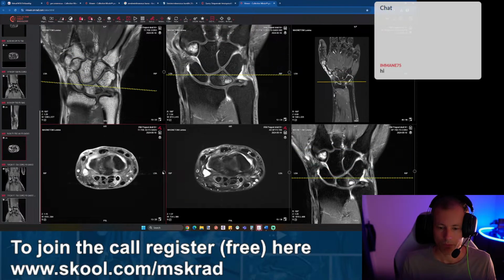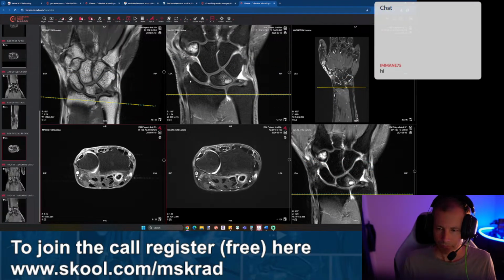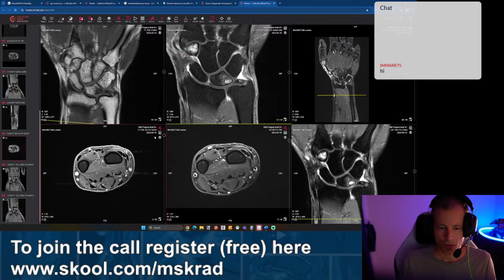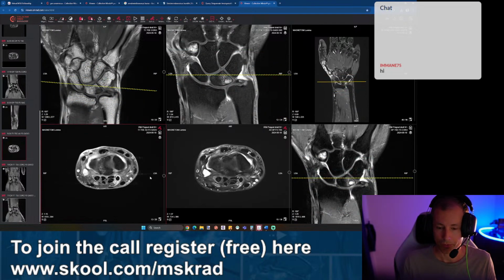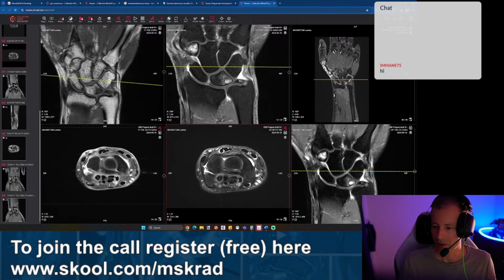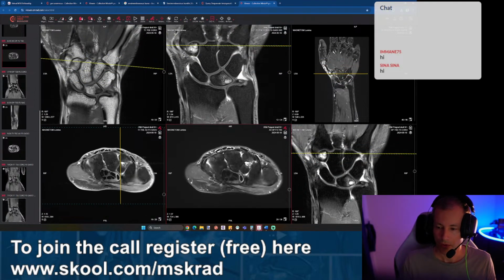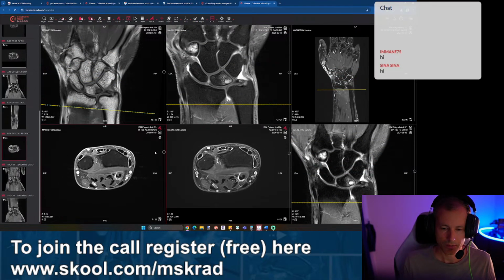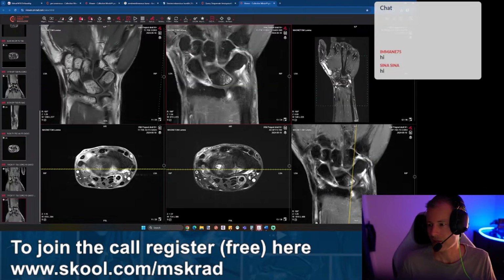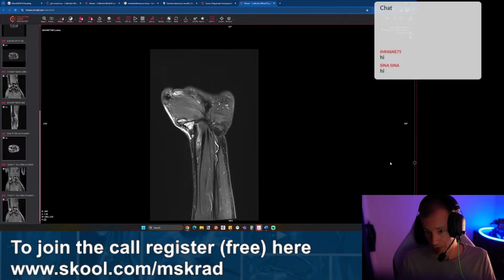So that's where we have to think about rheumatoid arthritis, and I would also mention this in my report that we have these locations with synovitis, tenosynovitis, and is suspicious of a chronic inflammatory disease like rheumatoid arthritis. And depending on the referring physician, I would actually recommend a rheumatologic follow-up, especially if it's not from a rheumatologist. Obviously, if it's from a rheumatologist, then he will already know what to do. But if it's from a GP referral, I would make him aware that he should probably have a look at, or refer the patient to a rheumatologist to get a better understanding.